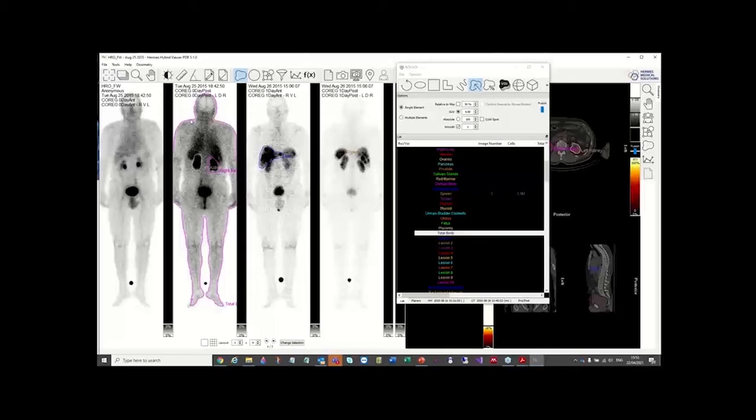We're doing this because we've imaged the patient here with a standard in the field of view. Otherwise, you wouldn't need to do a total body. If the program didn't find the whole body region, it would just take the total field of view count. And they go into calculating the remainder dose, which is a concept in Olinda. Any counts that aren't attributed to particular organs are set as the remainder.